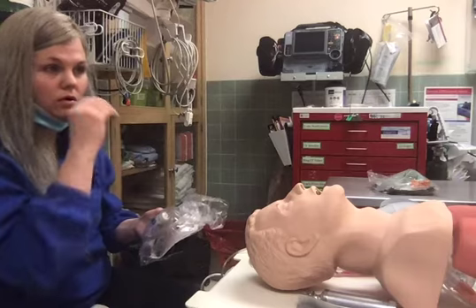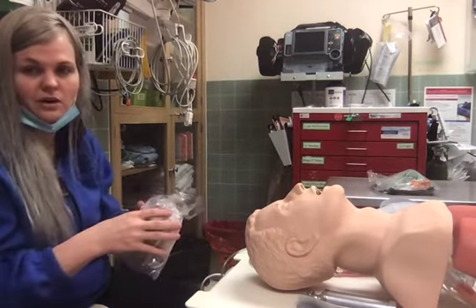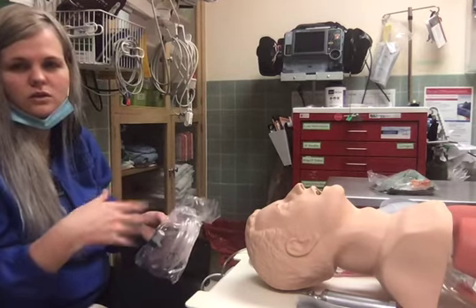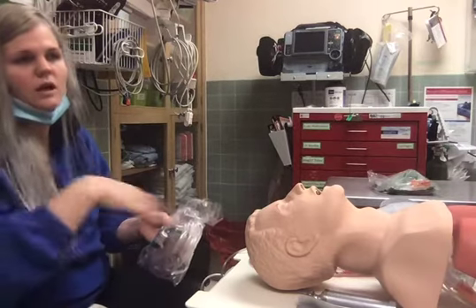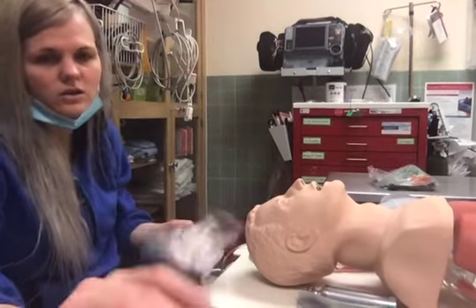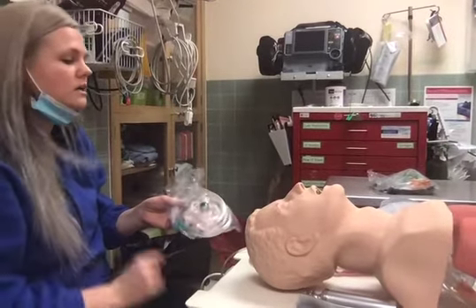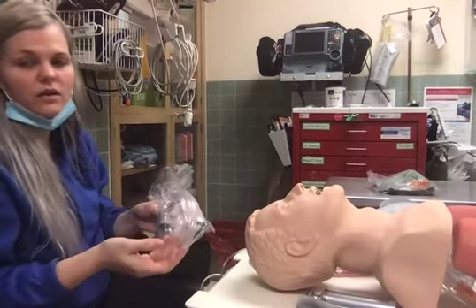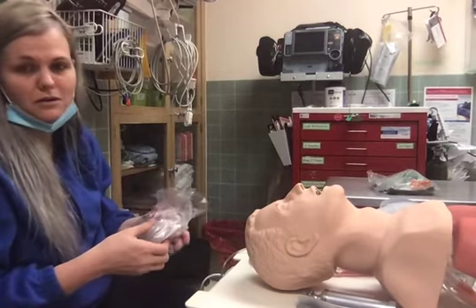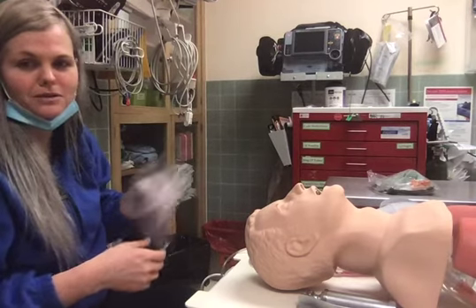You're going to want your liters per minute to be over 10 if you're just on the regular wall oxygen. That is to make sure they're not rebreathing any CO2 that they're exhaling into that mask, so keeping a lot of air moving through the mask is key. Contraindications, again, this is just increasing your FiO2 in your environment. This doesn't add any support in any other fashion. Once it becomes a ventilation issue rather than an oxygenation issue, this becomes irrelevant at that point in time.